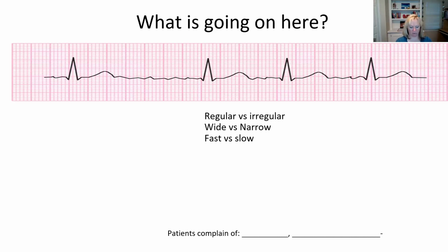Is it rate controlled? Okay, so the answer is, is it too fast? Yes, it is rate control. It potentially might even be going too slow. And sometimes with AFib, you'll see some pauses, especially if they're converting from sinus to AFib and going in and out of it. You'll have conversion pauses sometimes that are not something we would put a pacemaker in. We would just keep an eye.